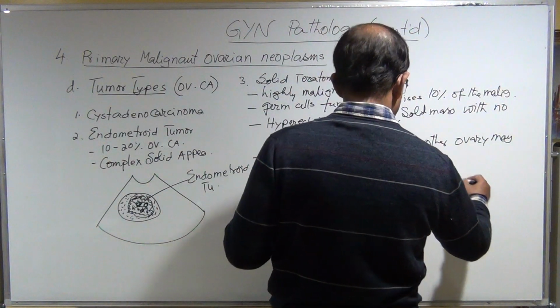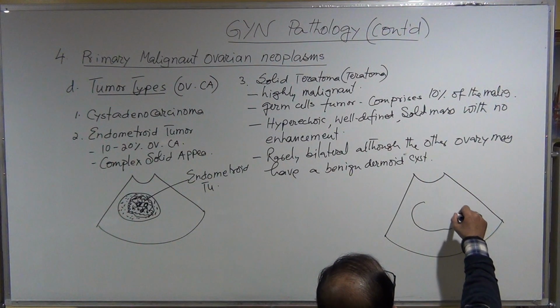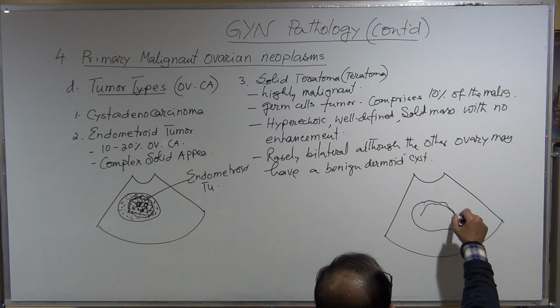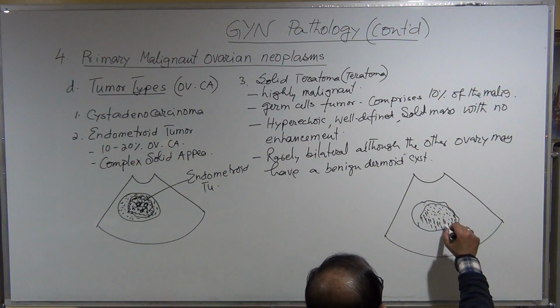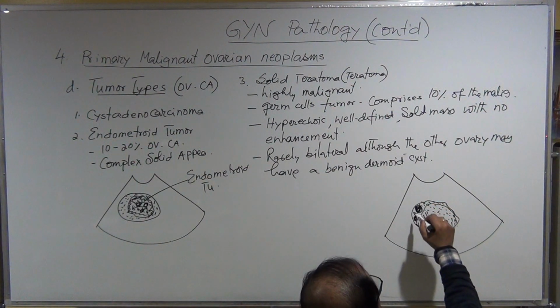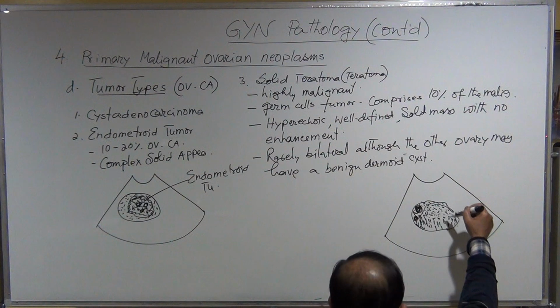Sonographically, how does it look like? Okay, so this is solid. Sometimes it is brighter here, followed by shadow.